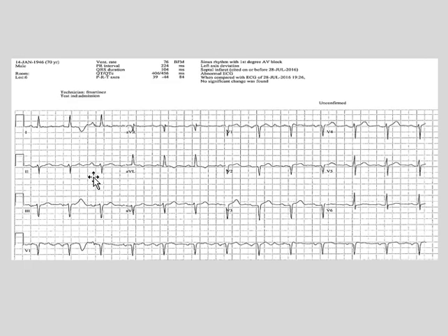Let's focus on lead 2 where they're normal. So we're in sinus rhythm. Lead 3, they're a little diphasic there, but I'm not convinced there is any atrial hypertrophy. Let's have a look at the rest of the ECG. There is no block that is obvious. There's a partial, possibly an incomplete block, but it's nothing you would call greater than 3 little squares.